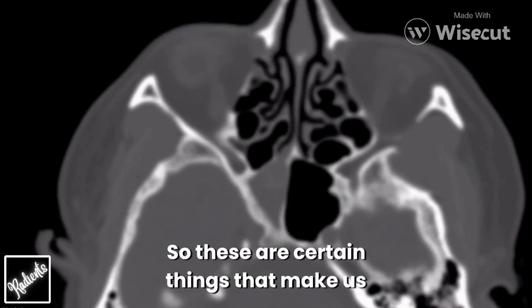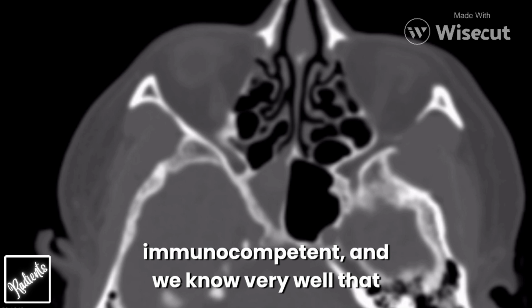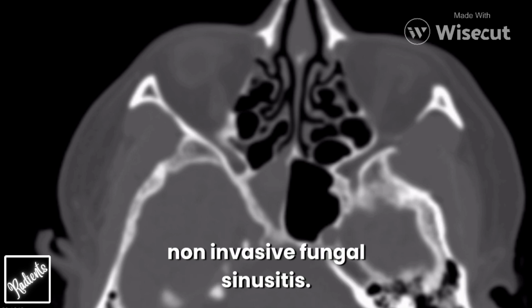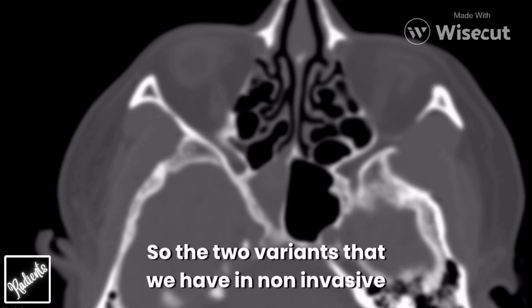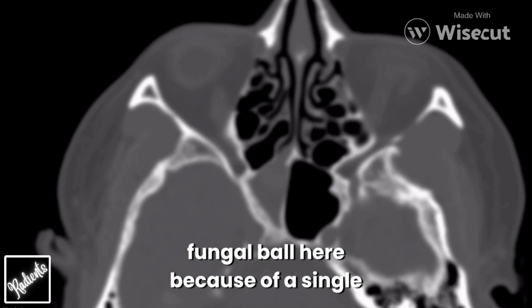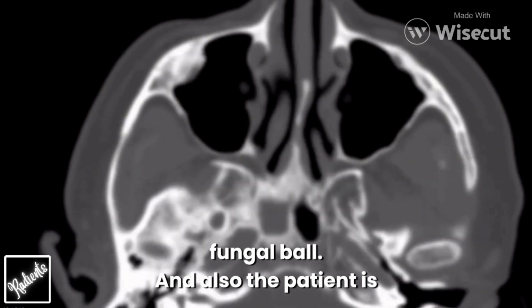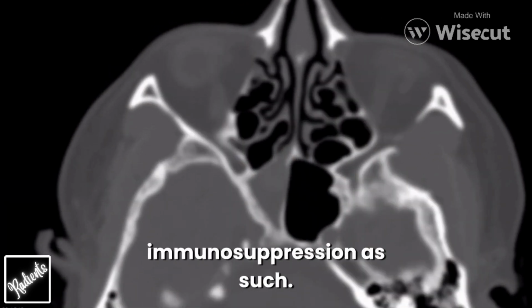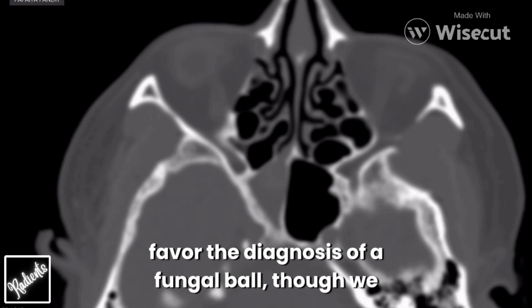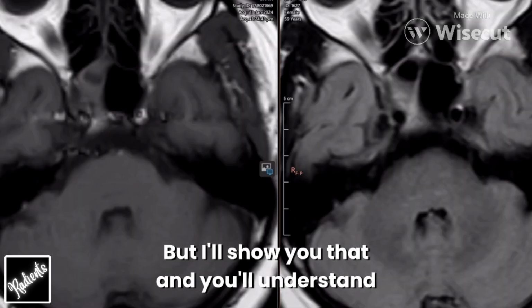So these are certain things that make us think of a non-invasive fungal etiology, also because the patient is immunocompetent, and we know very well that in immunocompetent patients we can have non-invasive fungal sinusitis. The two variants that we have in non-invasive are allergic fungal sinusitis and fungal ball. And we are thinking of fungal ball here because of a single sinus involvement, which is more common in a fungal ball, and also the patient is old, and there is no history of immunosuppression as such. So these features basically favor the diagnosis of a fungal ball, though we should also bear in mind the diagnosis of chronic inspissated secretion. But I'll show you that and you'll understand much better.